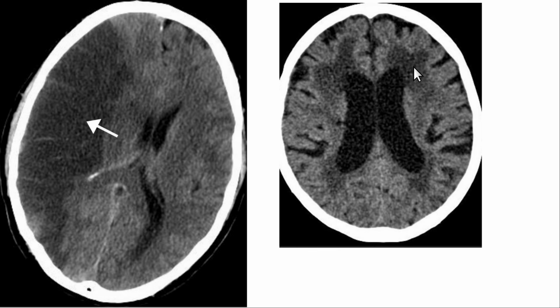And this is all markedly lucent, and that is all damaged brain from a lack of blood flow, either from overtreated hypertension or from microvascular disease, from hypertension and diabetes. And there are some other things that can do it as well, but this is a lousy looking brain. We'll even call these coalescent. The way I'd probably dictate this is extensive periventricular and subcortical coalescent hypodensities, most likely due to chronic small vessel cerebrovascular ischemic disease. Okay, so this is super common, and I often see this with cognitive impairment.